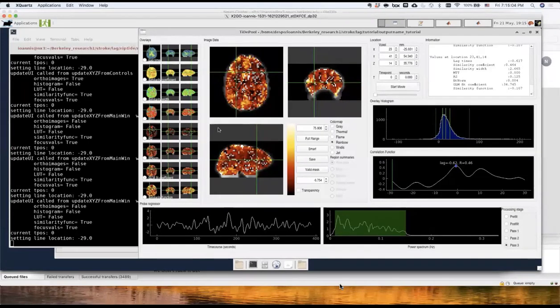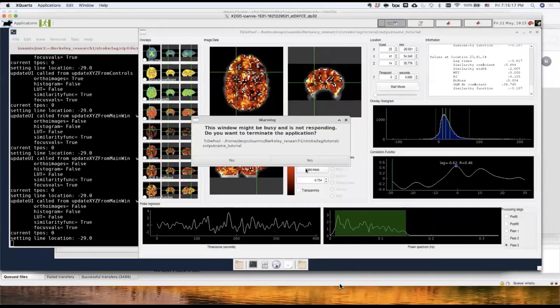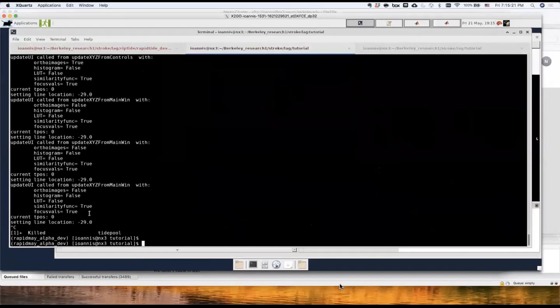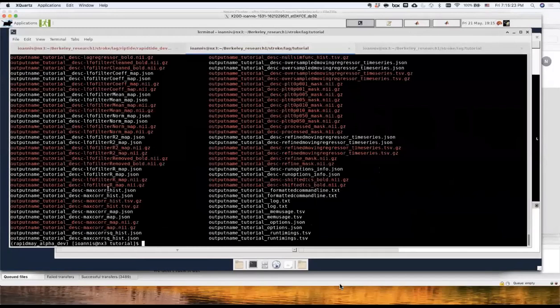What I didn't show you here, and this is something you can really find, is the actual denoised data that's been output in the folder that I just described. I feel that everything you need is in this folder that Riptide is producing all its data in. And yeah, I think this wraps up the basics of running Riptide on one's fMRI data.